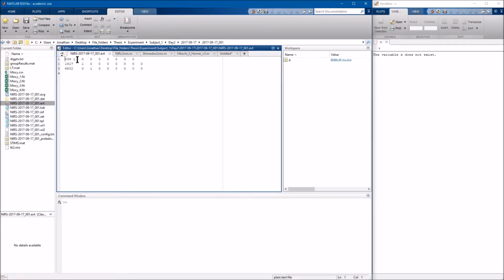You have your frame point followed by your binary code for whatever condition you're using. You also could look into the header variable, the .hdr variable, which is used in the Rob Cooper script.